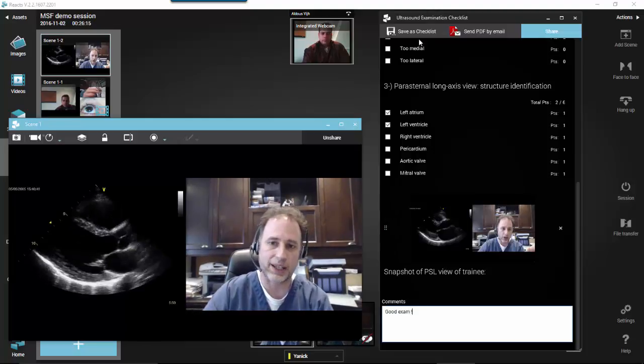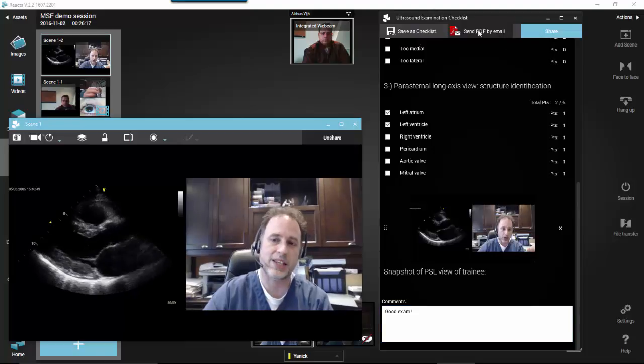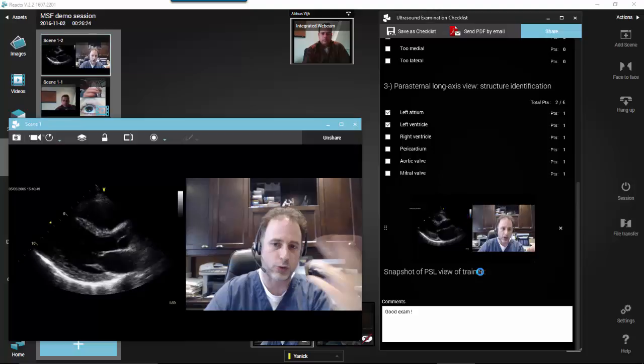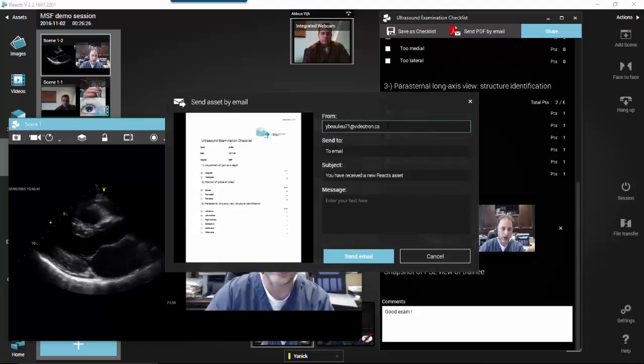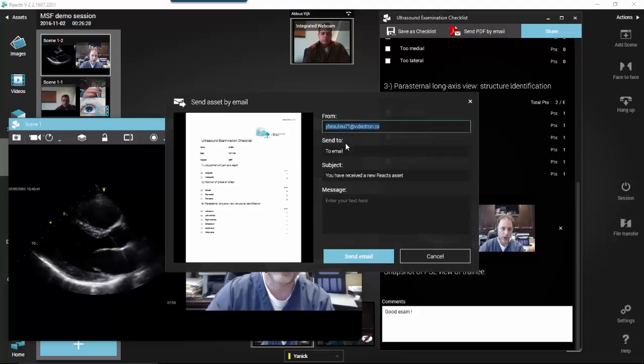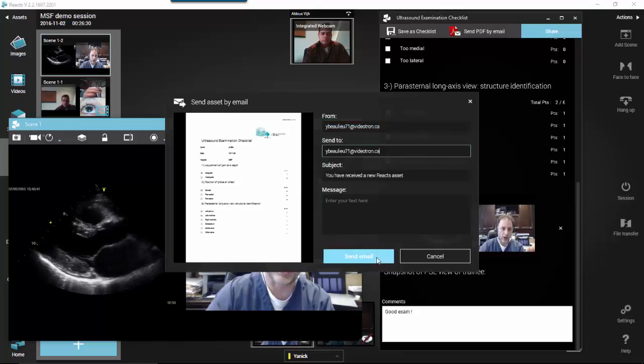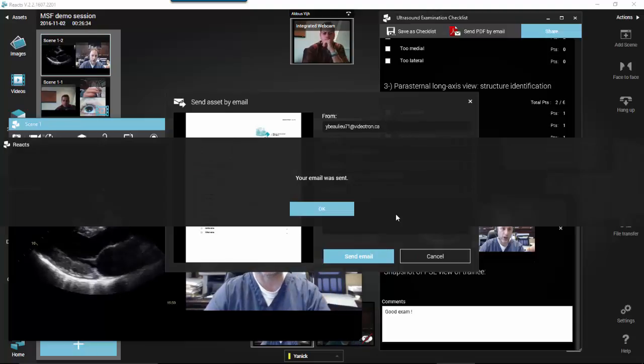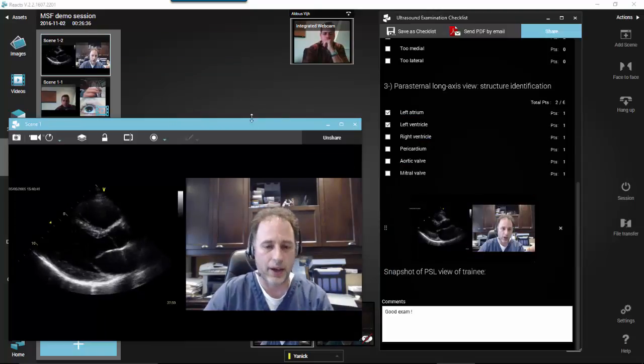And when I'm done, I can save it or even send it as a PDF to someone right away, okay? So send PDF by email. And when you're doing so, it constructs it in a report format. And I'm going to send it here to my mailbox, send by email. And then by doing so, right away, I'm going to receive the full report in my email.